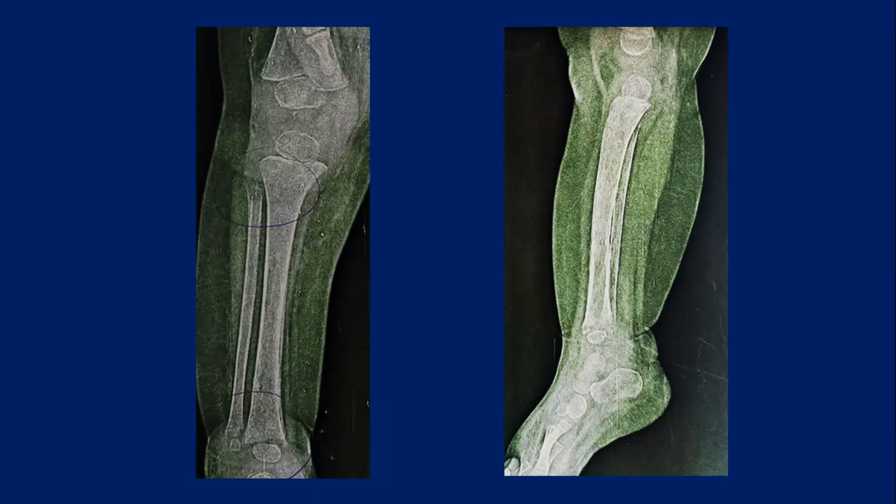Similar. Periosteal reaction also along the tibia. Yeah, there is a bit of medial periosteal reaction, agree. There's some periosteal reaction at the proximal fibula as well. But the only odd thing is the distal end of the femur looks fine. It doesn't show these changes.